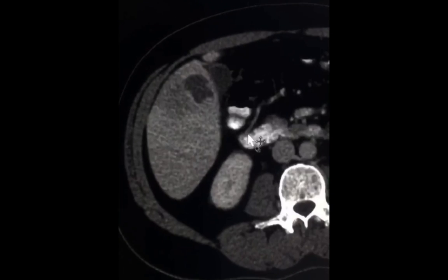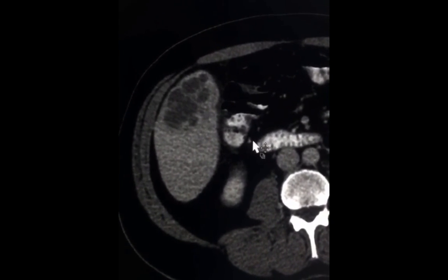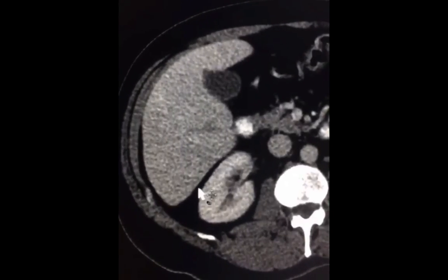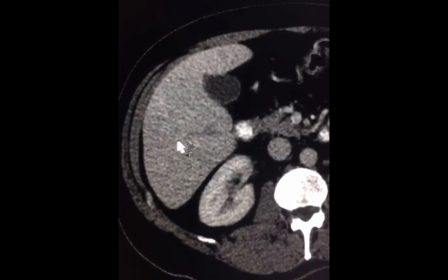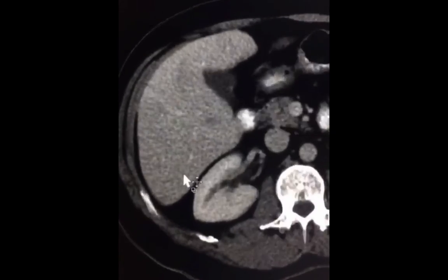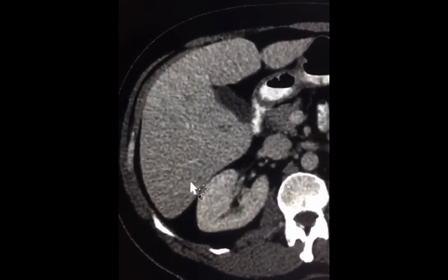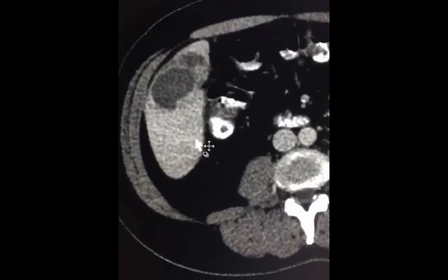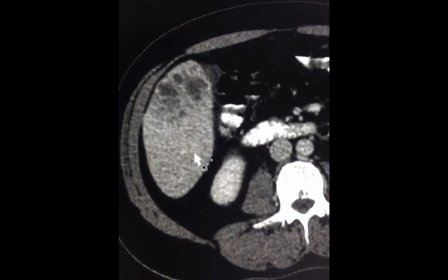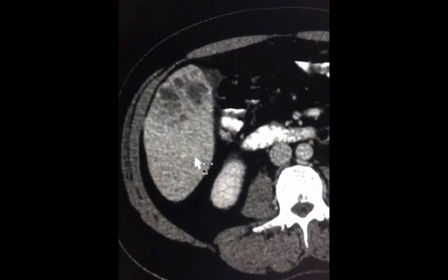Amoebic liver disease may result in patients who are immunocompromised or traveling from endemic areas, which is not the case here. Add to that the most common location of amoebic disease is in the dependent right liver, and it would be unusual for amoebic abscesses to be multiloculated or have a cluster appearance. So if you combine the clinical presentation with the imaging features, especially those suggestive of an inflammatory nature, you'd reach a conclusion of pyogenic liver abscess.